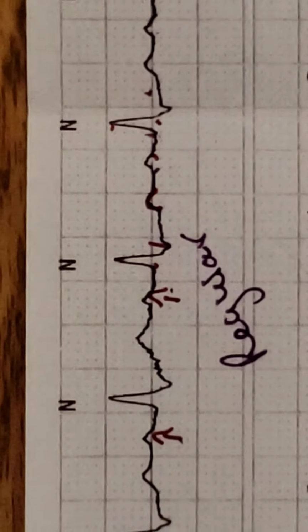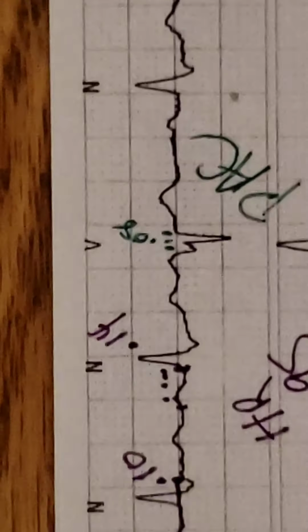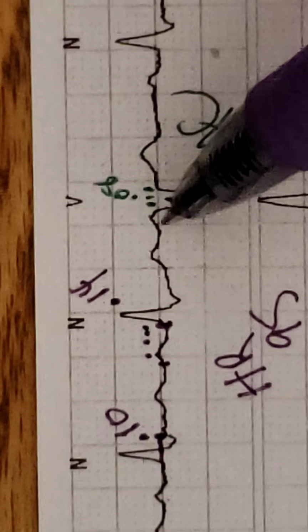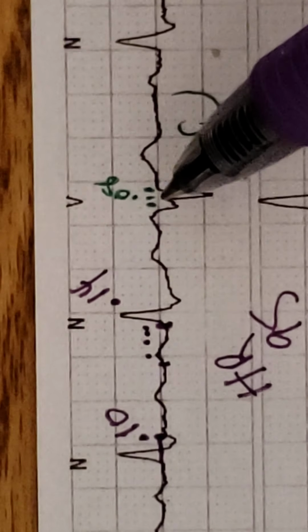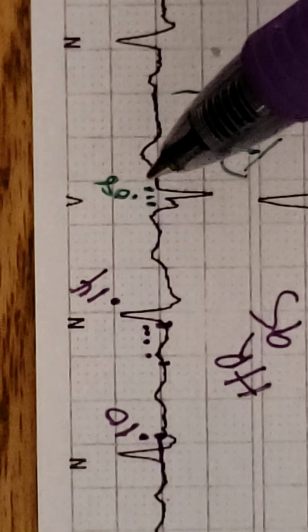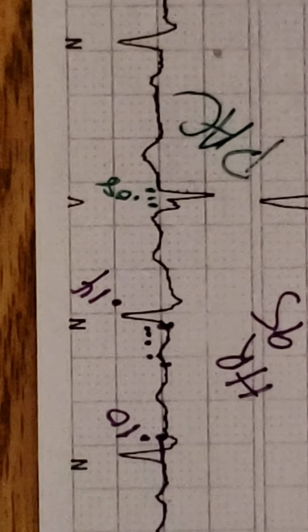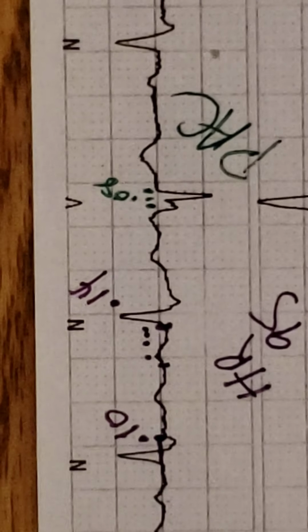But you can see there's a few odd little things about it, right? For example, this right here. We had our P, QRS, T, and then we've got this kind of weird change that occurs right here. But if you look at the time, it's only 0.08, 0.10. That's a normal QRS complex, and the P didn't really have that normal interval. So that's a PAC. That was a premature atrial contraction. It kind of went off before it was its turn, and then it returned to normal.